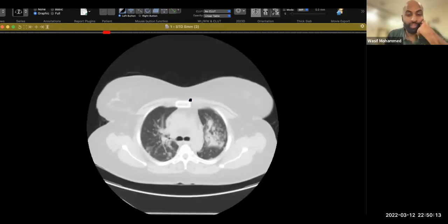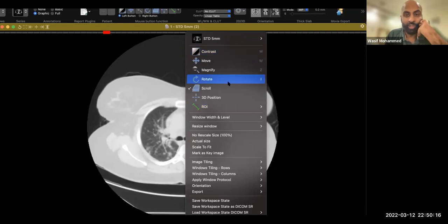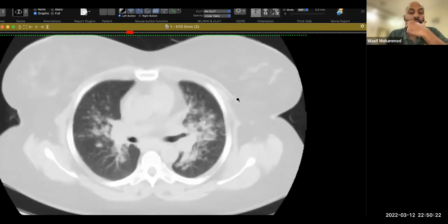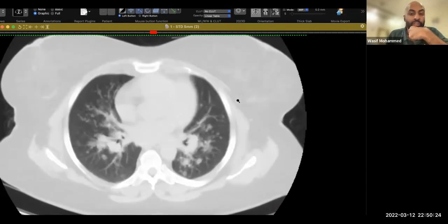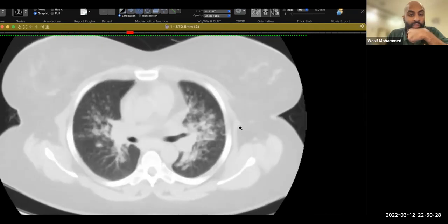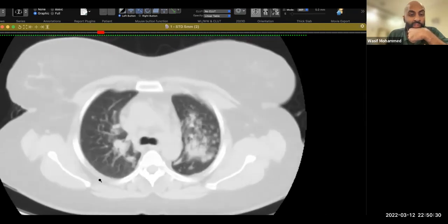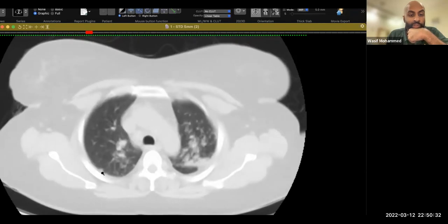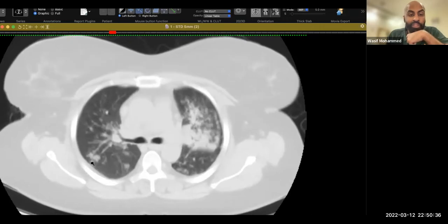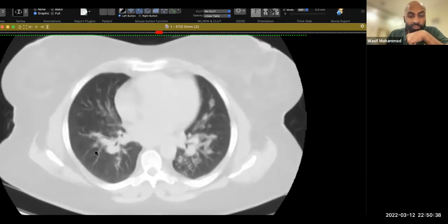So yeah, there is bilateral perihilar opacities, almost in a bat wing configuration, and there are multiple nodules. Don't just rush to say tree-in-bud appearance. So the nodules are again extending along the fissures. Are they subpleural or not? Some of them are subpleural, and some of them are coalescing to form other masses.